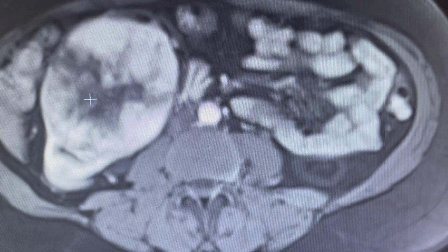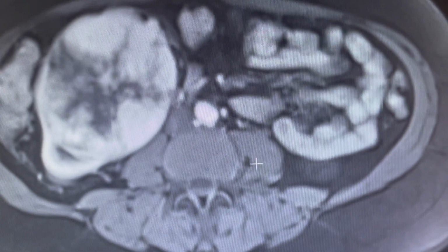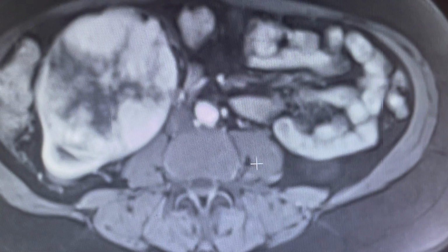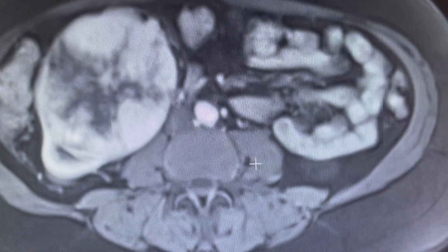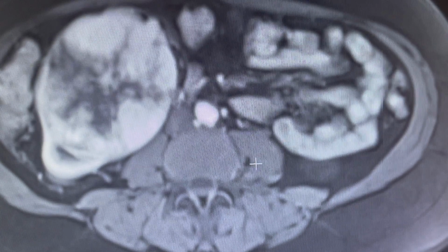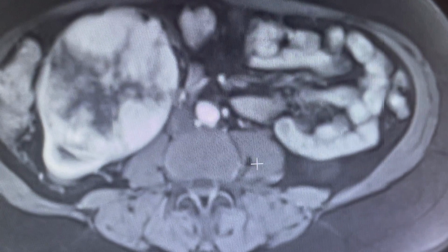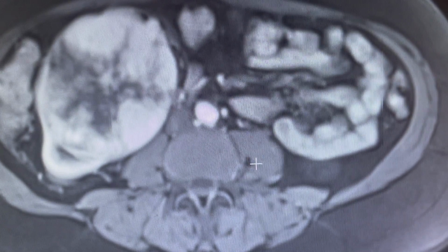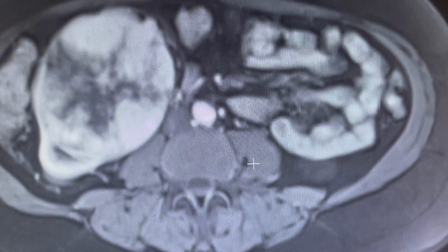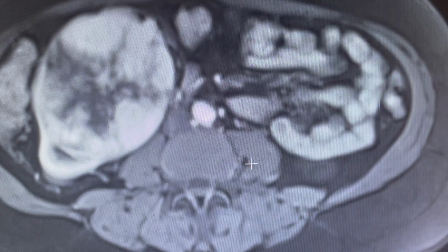So the next set of images, now before we get to the next set, I want you to pay attention to the bowel. Now, most recently I've described a disorder which I think is the most common disease now in the US, which is splanchnic inflammatory syndrome, which is essentially inflammation of the splanchnic system that can be anything from as minor but significant to the patient as stress, all the way to the metabolic syndrome, which of course I prefer describing as the splanchnic metabolic syndrome.